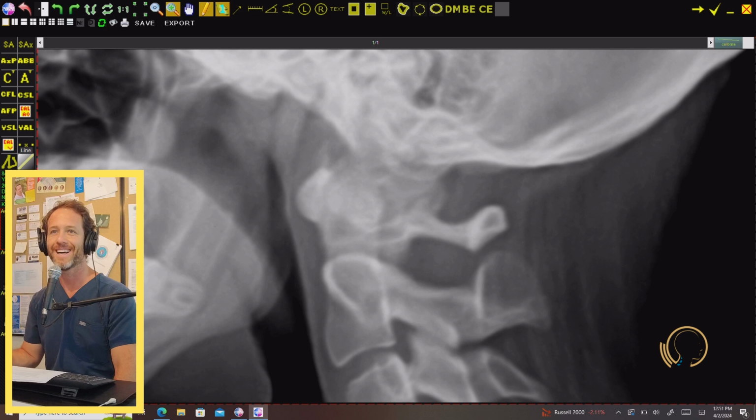I should place a dot where the lateral mass and posterior arch intersect. Okay? And again, this is going to be based on, if you got pencil and plain film, but for purposes of just review for anybody out there. And then we're going to be a quarter inch behind that, let's say, right? In practice, this is not what I do every day with this software, but just for review.